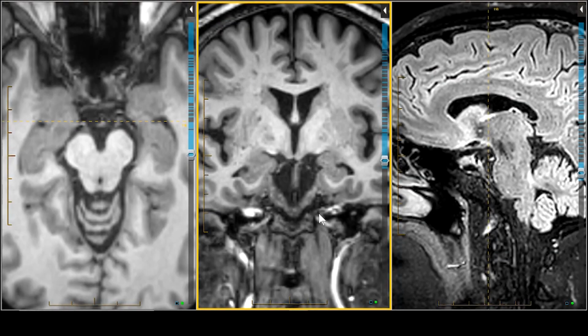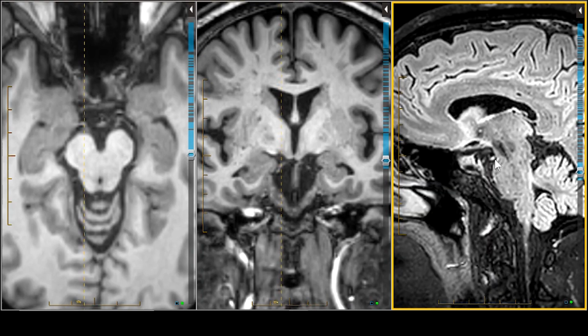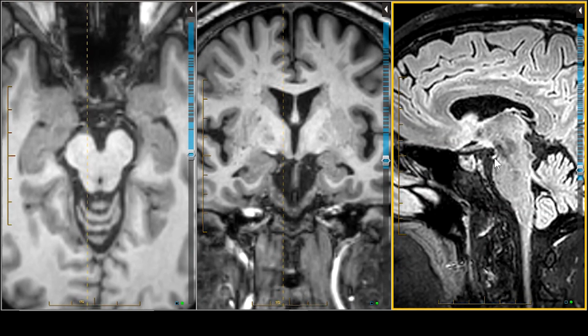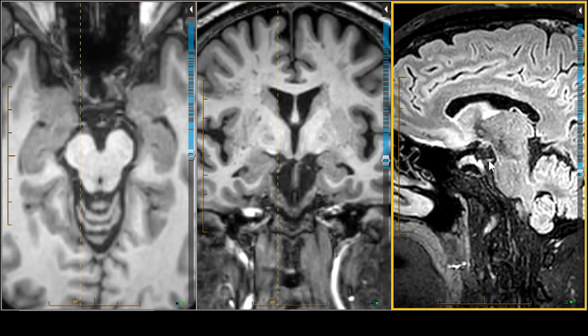Let's talk about the third nerve. The cranial nerves are pretty small, and that's why we have 3D, 1 millimeter or sub 1 millimeter slice thickness that we have reformatted from the axial into the coronal projection. And rather than using the reformat, I've put up the sagittal 3D FLAIR, which shows the apparent exit of the third nerve from the interpeduncular cistern in the midbrain. You can see it quite well on the FLAIR, bathed by dark signal intensity fluid. If only it were always that easy, and it is when you have thin section imaging.